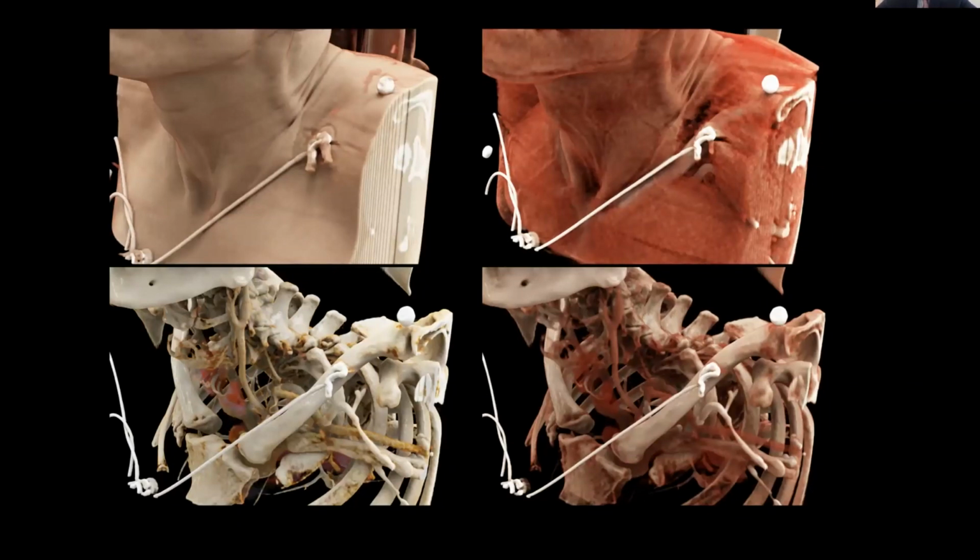So the short answer after all of that is to say that, yes, I think overall this is an accurate representation of the anatomic structures. But you do have to be aware of the fact that there have been several layers of processing, and that the layers of processing are dependent on individual decisions as to how they want to depict various structures.